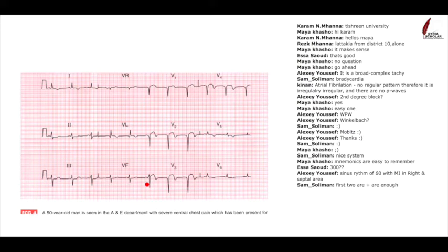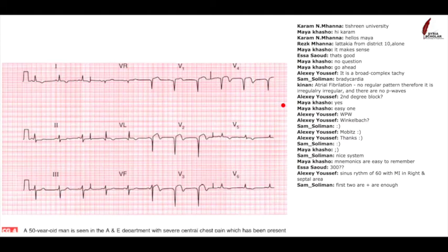And how are we going to decide if that happens? So we've done our QRS complex. Now we're going to come to the ST segments. And this is where the fun happens.